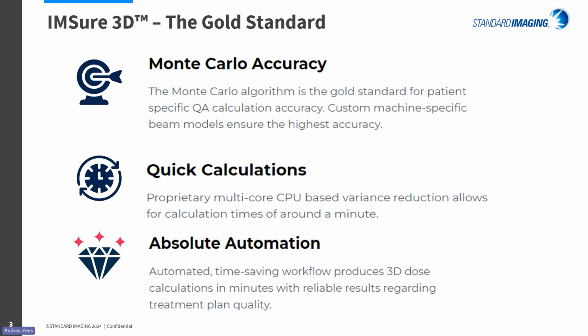And third, absolute automation. The automated workflow and streamlined user interface will fit into any clinical workflow. Calculations are automatically queued and quickly calculated following the automatic DICOM export from the treatment planning system. Patient work lists are automatically updated and email alerts can be sent based on custom criteria.